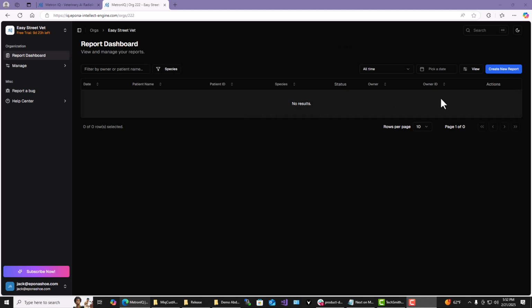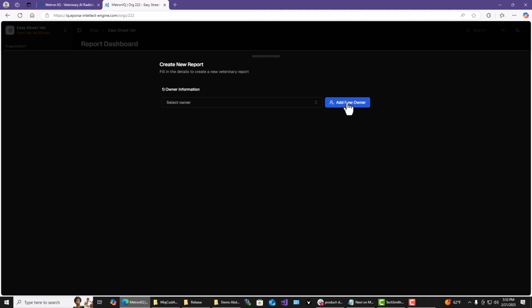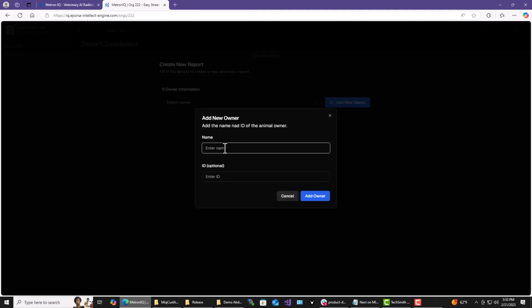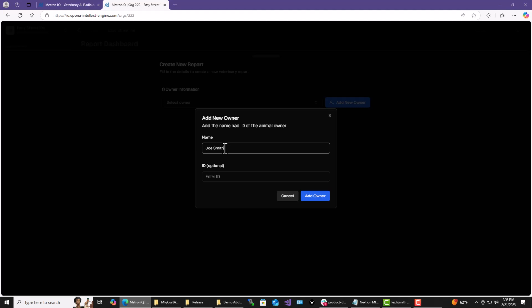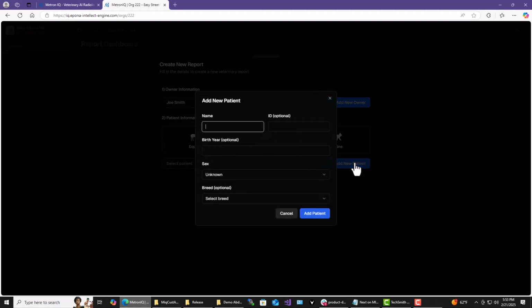So to get started, you come up here and you click Create New Report, and you'll be prompted for an owner, the animal name. So let's put in an owner, Joe Smith. Add that owner to the system. And now is the animal a horse, dog, or cat? We'll say a dog. We'll add a new patient named Fido.